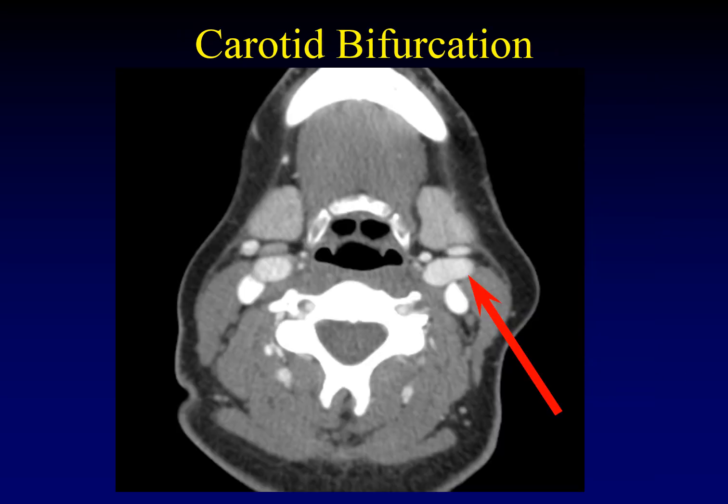Here's a situation where the carotid bifurcation maybe swings a little bit closer to the skin surface. It's coming out between the sternocleidomastoid muscle and the submandibular gland. That makes it more easily palpable from the skin. You can see it's a little deeper on the contralateral side. Patients will appreciate that asymmetry: I can't quite feel it on this side, I can feel it more easily on this side. This is actually a very common thing for thin people to be able to palpate, is their own carotid bifurcation. Hopefully they don't massage it too much and get themselves to pass out.